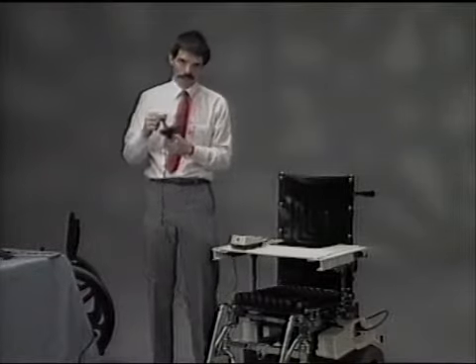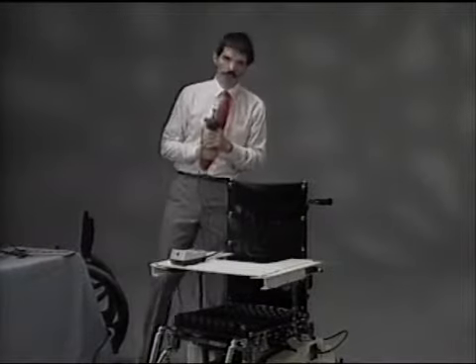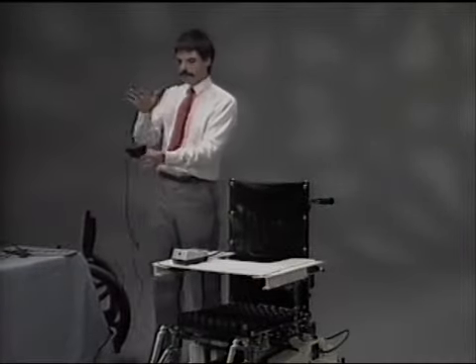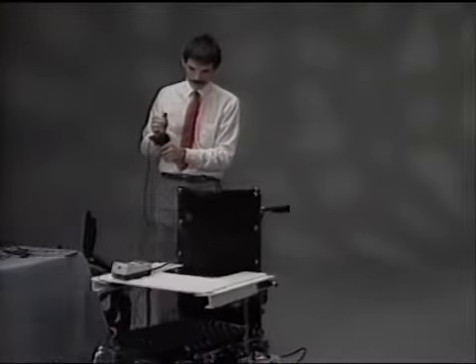What's nice about this, it's also virtually indestructible for kids, but if they do destroy it, you pay $9 to have it replaced, and you don't even look at fixing it, as opposed to the others, which run a couple $100 each. Now this one, if I grab hold of it and floor it, I only go forward at one speed.